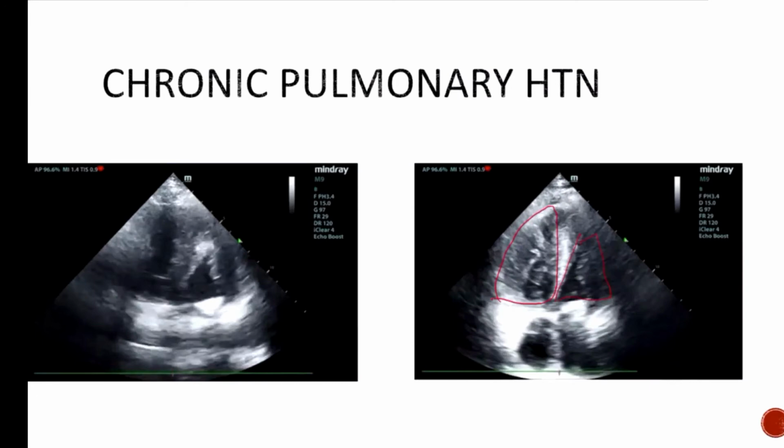in relationship. We also see all these trabeculations? These are unique to the right ventricle. And so you have increased volume and density and size of the trabeculations within the RV. And that's going to hint that this person potentially has chronic pulmonary hypertension rather than acute pulmonary hypertension.